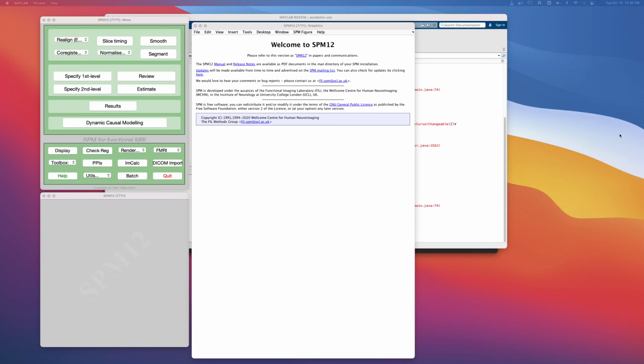Okay, in this next step, we're going to use MATLAB and SPM12 to view the T1, T2, and EPI images that we just converted from DICOM to NIfTI. And it's a good habit to do this, to always open up the files for each subject so you can inspect them visually to see if there are any problems or errors in the data collected before you even go ahead and process them.